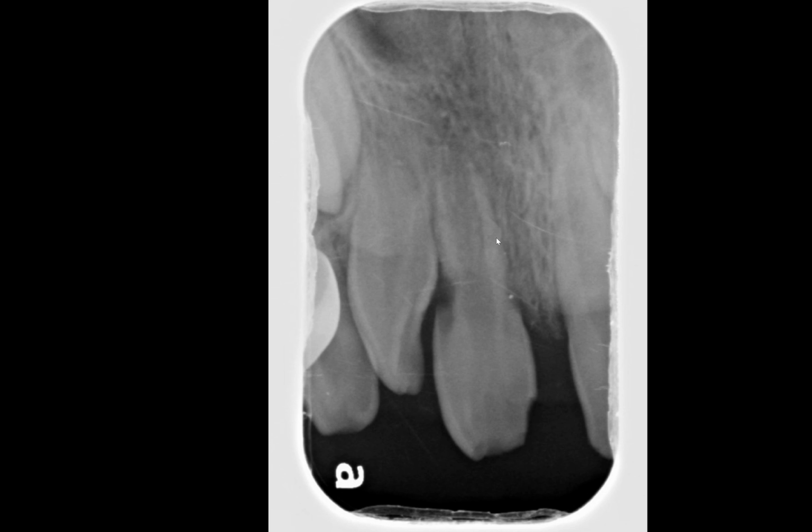Furthermore, I want you to see the overall width of the canal space and the thickness of the dentin. Look at number 9. While you may say it's not clear to visualize the pulpal space, it looks definitely narrower than what we see on 8. Additionally, the thickness of the dentin, or the root, is definitely thicker.